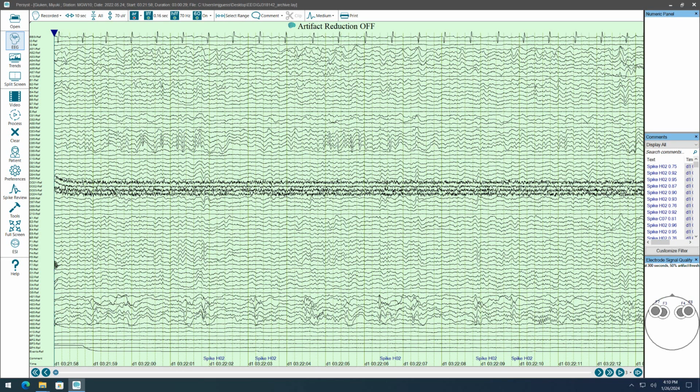Hello, in this screencast we're going to go through the process of archiving or clipping EEG and saving it to a different format. My name is Michael Guest, VP of Research and Clinical Applications for Persyst. And we're going to use an intracranial recording that has some features to it that allow us to explore some considerations to make when archiving EEG.